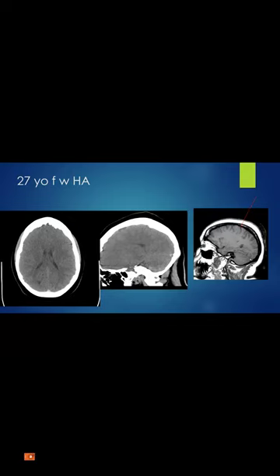Here, this patient was an outside hospital referral. We see this was missed: basically there is a thrombus in the transverse sinus. This was, I think, a pregnant patient, and they did a CT. There was nothing, and then they did MRI without contrast, and they didn't do a venogram. There is this hyperintensity on T1, suggestive of thrombus or partial thrombus.